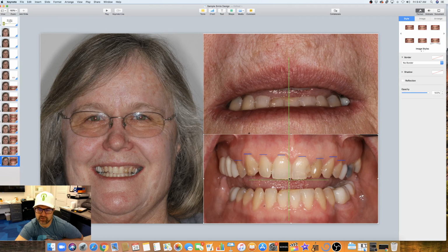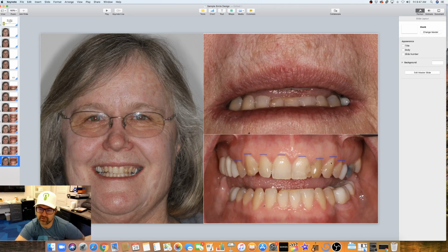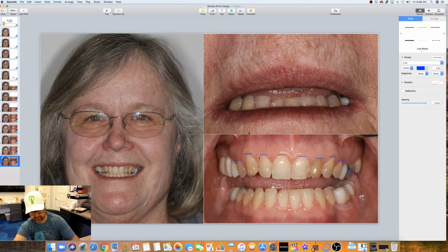Next thing you might want to do, I'm going to take these lines off again. Next thing I like to do is play with the inclination of the teeth. You can even do the same thing here. Let's just do it for fun. Let's go ahead and Command C, Command V.